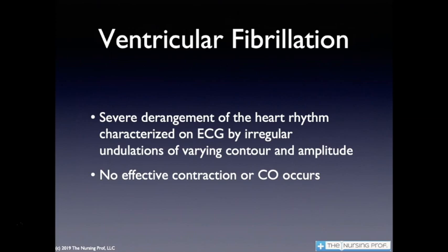In this situation now, in ventricular fibrillation, the heart is just basically quivering, and there's no contraction that's occurring here because we have all sorts of little pacemakers that are firing off, trying to get the heart to restart. The problem is all of those impulses all over the place are causing localized contraction or localized depolarization, but they're not depolarizing the entire heart.